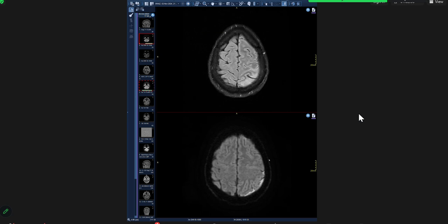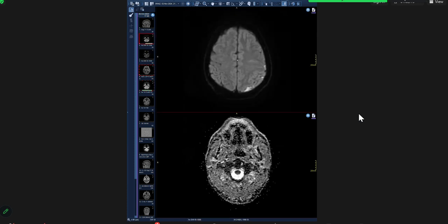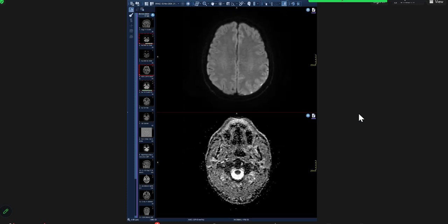Okay, so ma'am, can I have more images or do I have to give the diagnosis on these two images? No, you can, but what are you thinking? I'm thinking on the lines of infarct, as it is giving diffusion restriction. So, do you think that this is involving the cortex?